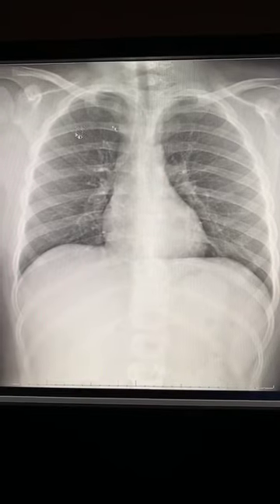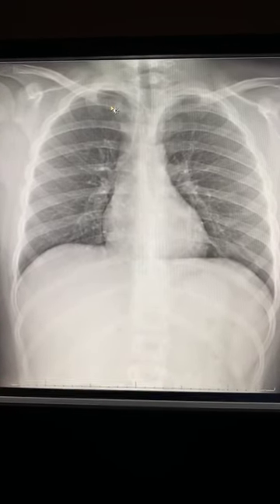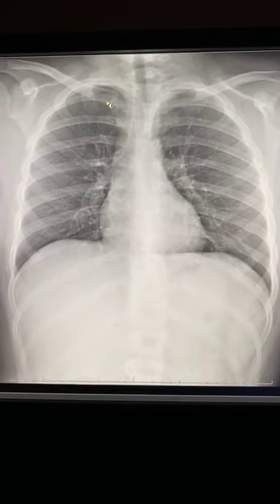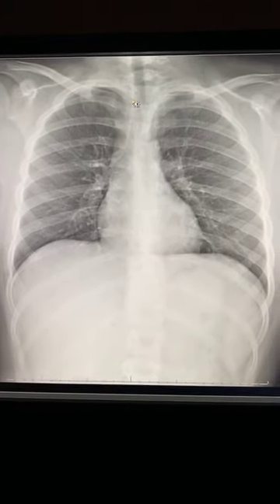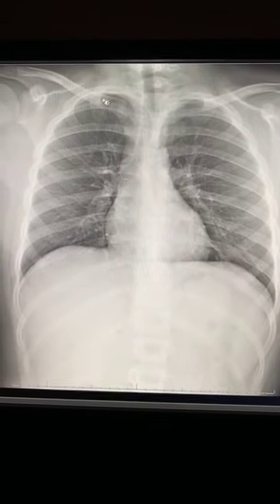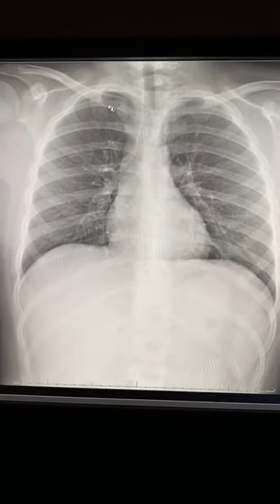There are two lungs, obviously, different lobes, but I'm gonna start comparing side to side. This is, once again, the way I do it. If you wanna do it some other way, hey, more power to you as long as you get to the correct answer. But here's how I do it. I start off up here. This is a trouble spot, and we'll get into why. But this can be a very troublesome spot for finding underlying malignancies, that kind of stuff.